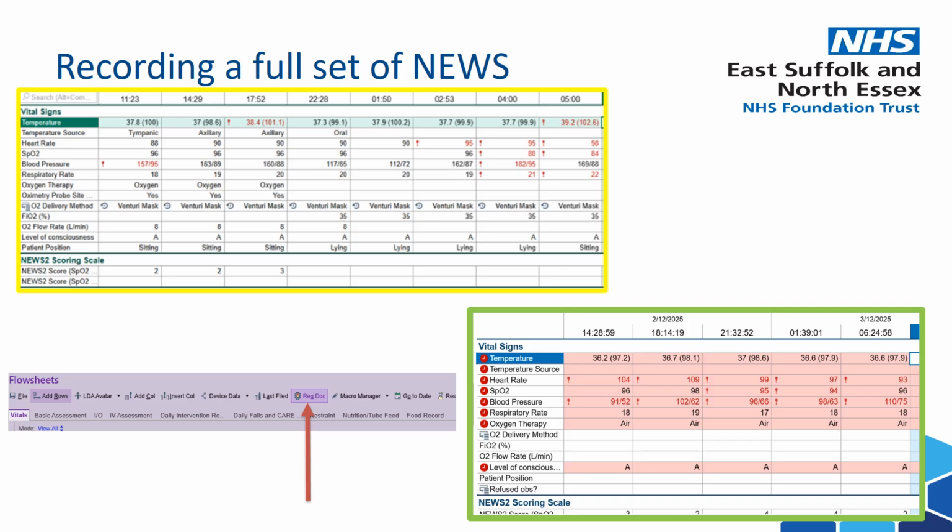The patient example in the yellow box on your screen does not have a full NEWS completed. The element missed out was the documentation of whether the patient was on air or oxygen. This is titled oxygen therapy. Without this information, a NEWS score cannot be produced. This patient should have had a NEWS of 10, but no one can see this due to the missing element.